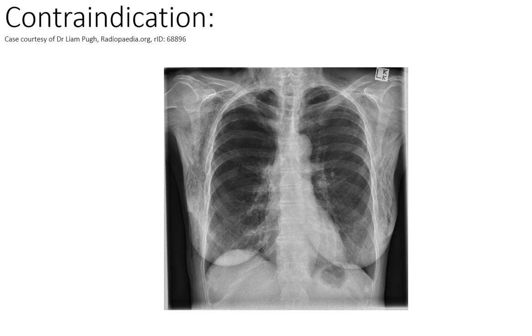So this means that there's a leak somewhere. So again, I wouldn't be doing a load of positive pressure techniques. Also, there's no point in auscultating this patient because if you put your stethoscope over those tissues, all the air will sort of like Rice Krispies, it will pop, pop, pop, pop, pop. And if you keep pressing, ultimately the air will move out from under the stethoscope and you might be able to hear something, but it's not very comfortable. But you can feel it when you touch somebody, you can feel the air under their skin popping.